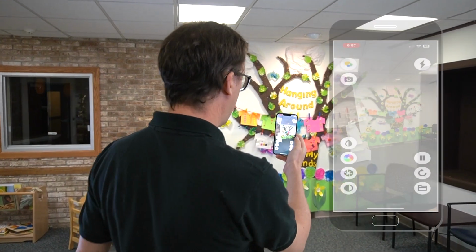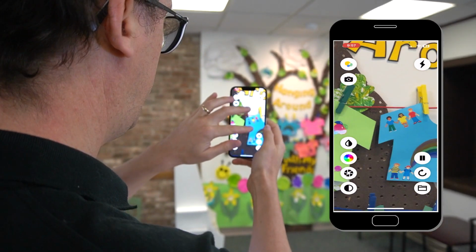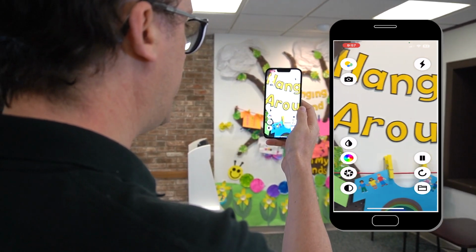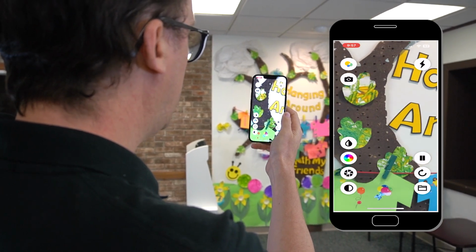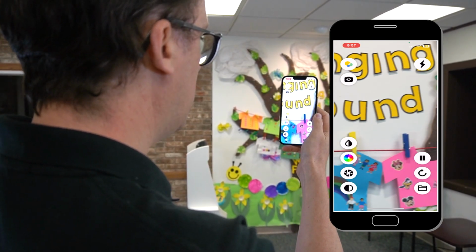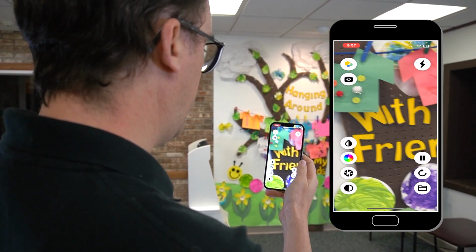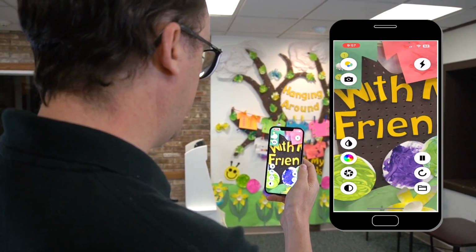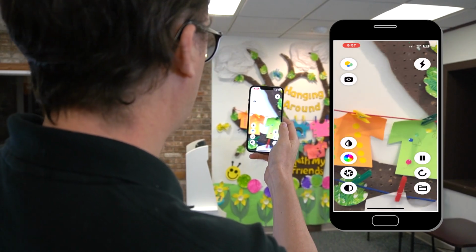First of all, the ReBokeh app, we will open it up. We will do our pinch zoom to zoom in there. We're pretty zoomed in at this point, and now we're going to start moving the camera. You may notice as you are moving the camera that it feels a little bit strange, and that's because we do have some image stabilization going on here, and so that helps to give us a smoother experience as we pan. But this one feels a little bit odd to me. It feels a little bit laggy. That could just be me though, so I'm not going to dock any points for that.